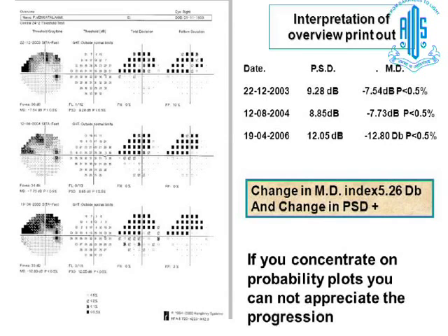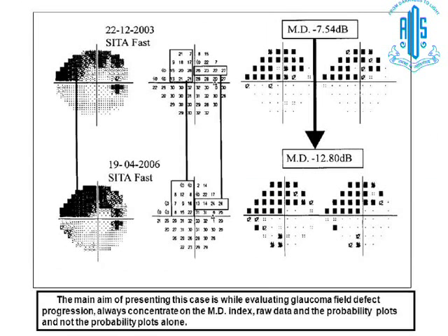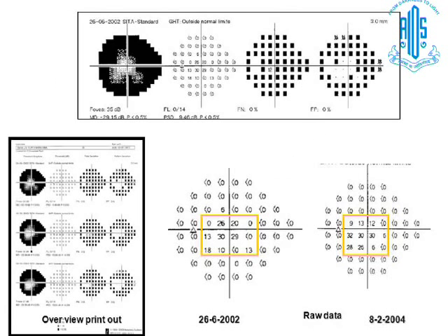Horizontal progression is not there. Even if it is there, it is minimal. So you see, 21 became almost absolute scotoma. In this case, I tell you another most important concept. This patient has all absolute scotomas surrounding and few retinal sensitivity points.